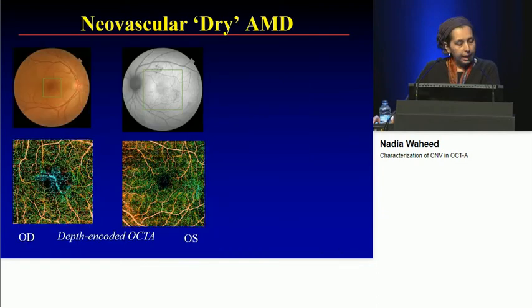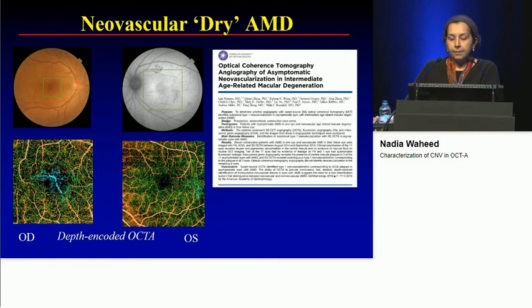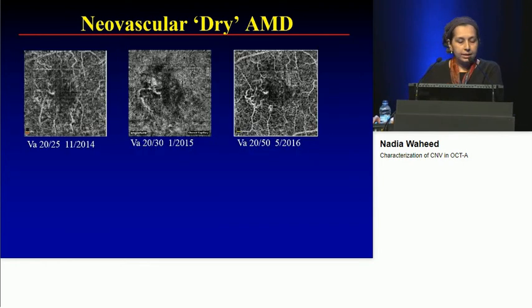And we do an OCT and an OCTA on him, and we find that he has these subclinical, non-exudative, subretinal type 1 CNVs. And these have been described, I think they were first described by Phil Rosenfeld's group and have subsequently been described by several other groups. And really almost 1 in 10 patients with dry AMD who don't have exudation may have these subclinical CNVs that underlie these lumps and bumps that you see in the retina. And so what to do with these patients?